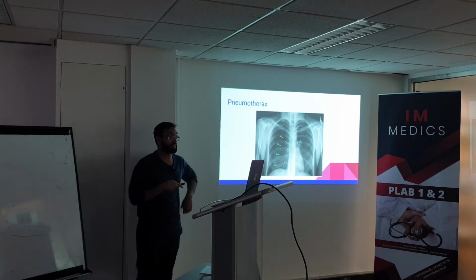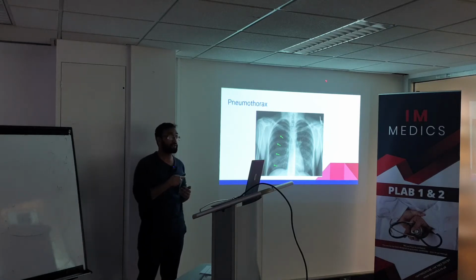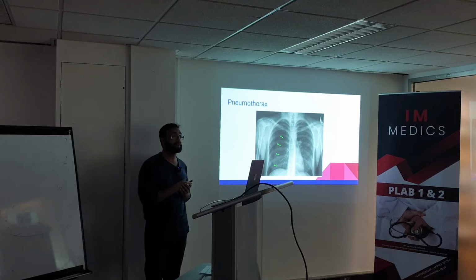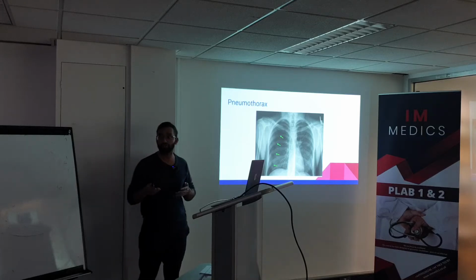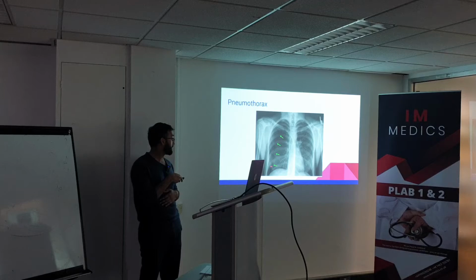And pneumothorax. This one is very important to know in X-ray, because it becomes quite difficult to see it sometimes. But can you see here, what is pneumothorax in the beginning? Yeah, so in between the parietal and the visceral area, there is air, and it's usually caused by trauma, or it could be spontaneous pneumothorax. And you can see here, there's a well demarcated visceral layer.